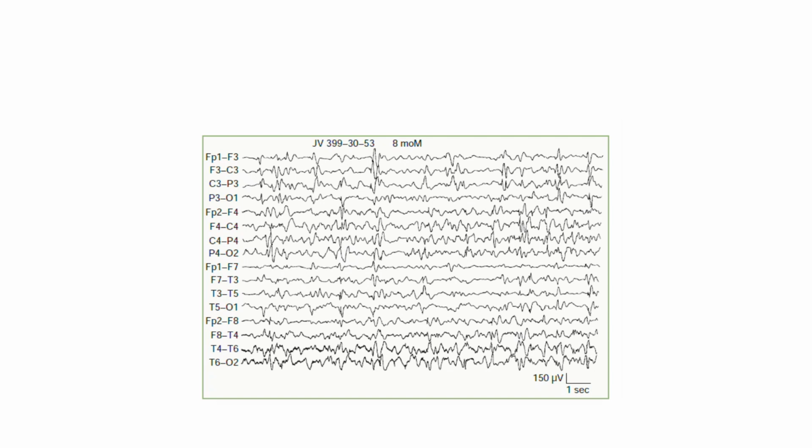Sharp, epileptiform discharges are firing constantly, but they are completely asynchronous. You can see a spike focus in the left frontal channels, another independent focus firing a split second later in the right temporal channels, and random slow waves scattering across the posterior leads.